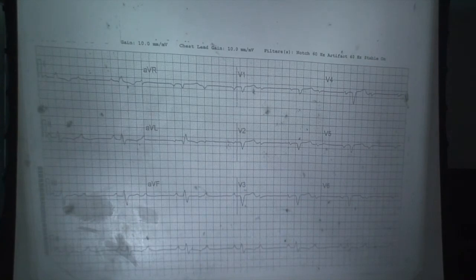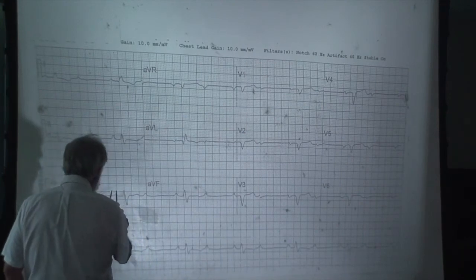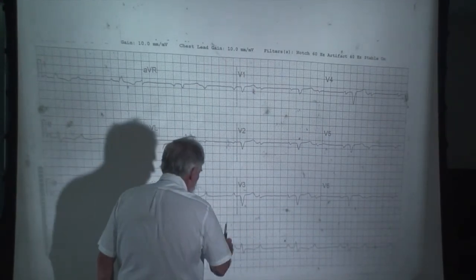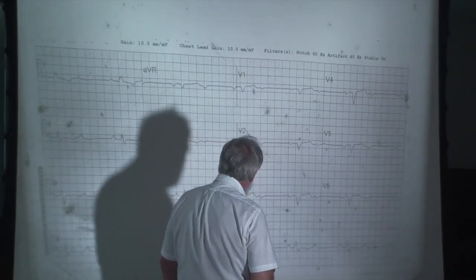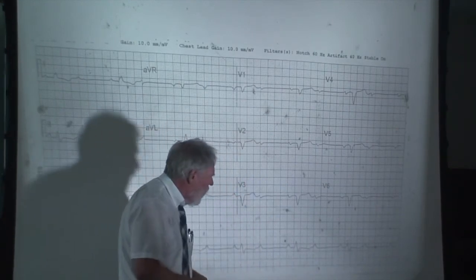Dr. Arndt? Could that possibly be third degree? It seems like those P's are separated. I think this is regular, and I really think that these P's are all conducting.